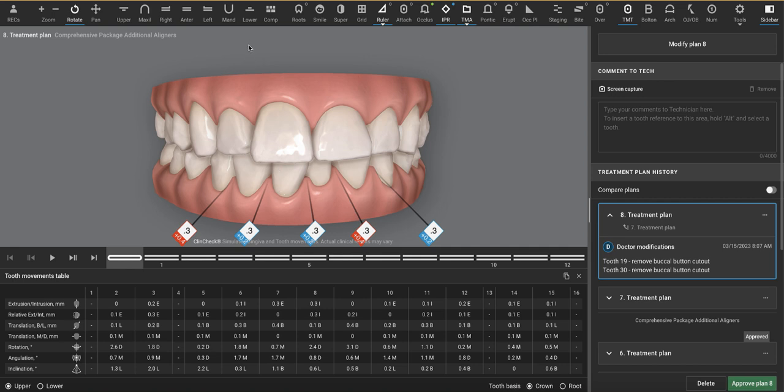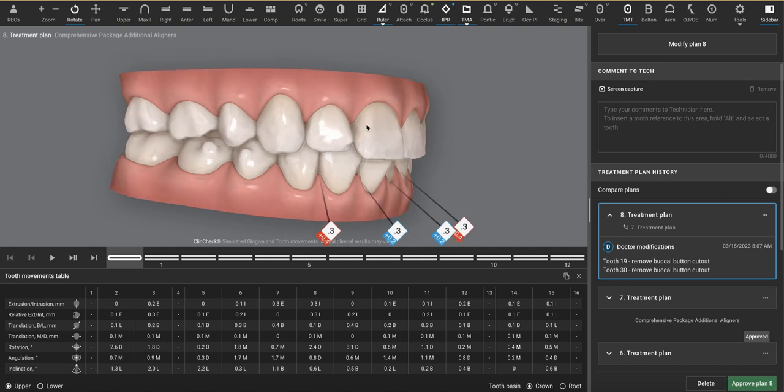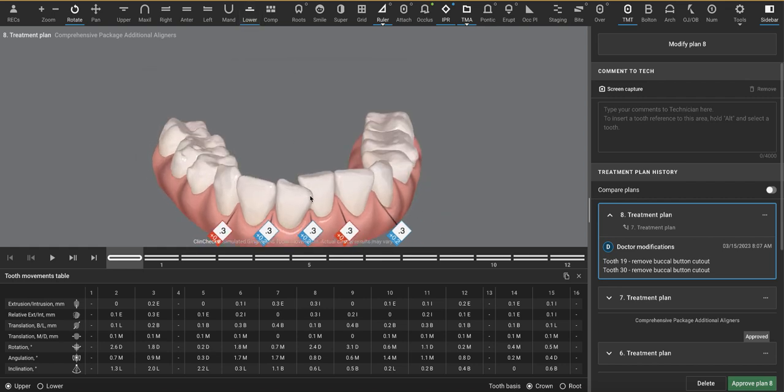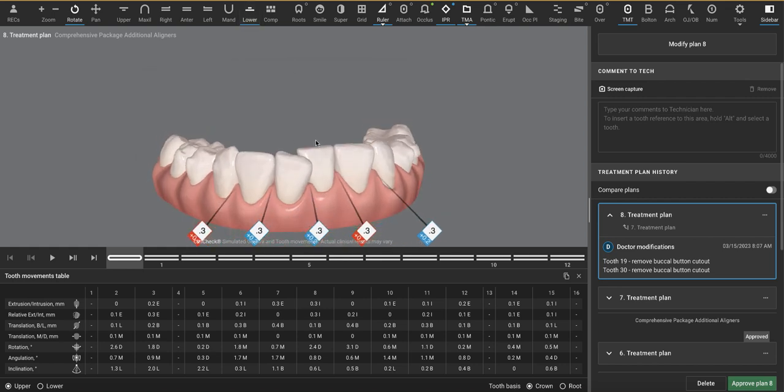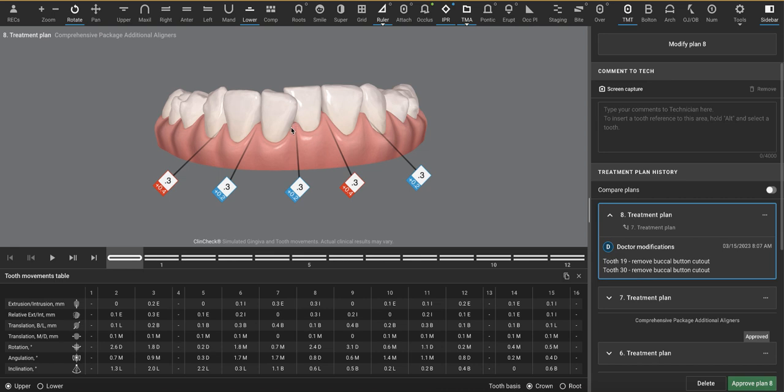We had discussed emphasizing to the patient that doing IPR in a patient with TMD and a potential airway and already deficient arch form, based on the fact she's missing her premolars, is not advisable. She only just wants to unravel these here. So here's what I'd recommend. Before I go through that, there is a concept that I want to share, which is the following.